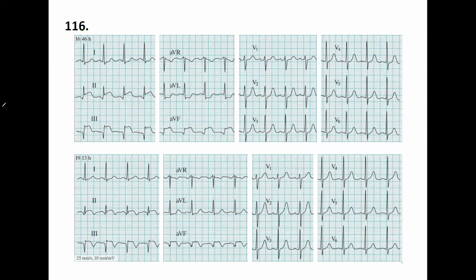That's me. So I felt this is a rhythmic ECG, on the top of the graph, yeah. And there is less than 3 boxes, or maybe around 3 boxes, so it was more than 130. Well, if I say this is more than 3, but close to 3, so it's 100 or maybe 95 or so. So it's okay, all right. So it's 100, normal. Say it 95.